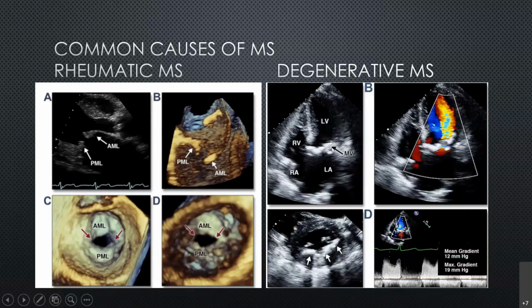The MAC itself is so severe, causes a lot of shadowing, and there's also blooming artifact around it. A lot of times associated with mitral regurgitation, and on short axis, the whole annulus, posteriorly especially, is all calcified, right? But again, this is a big problem to deal with. Patients are older too, so treatment is not that easy in these folks.